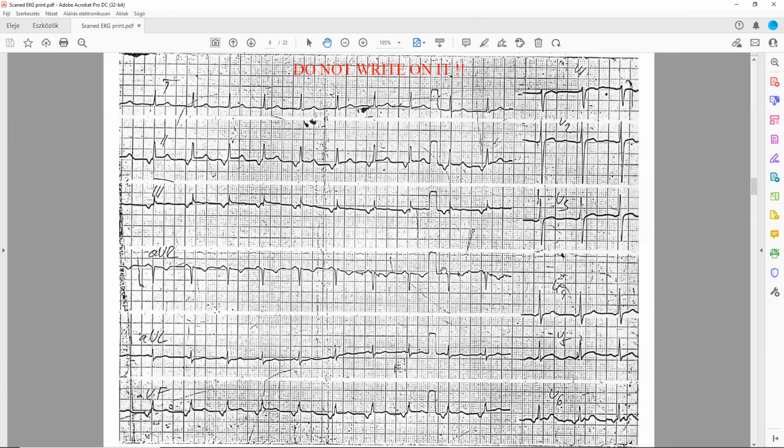Rhythmic or not? I can see that it's rhythmic. Okay, that's rhythmic, and heart rate is around 90 BPM. Okay, go on.